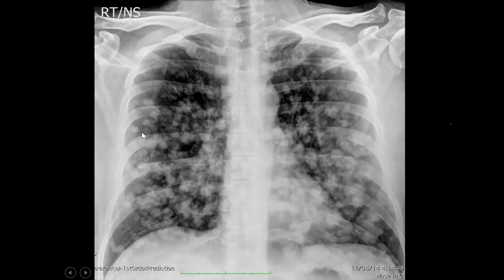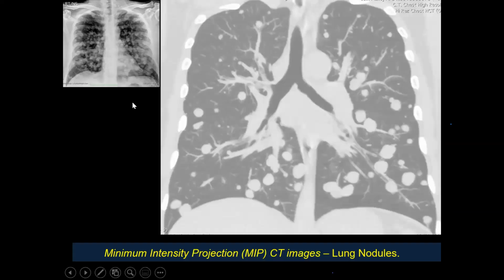If the lesions are of variable size, like one lesion is small, one lesion is large, with variable size lesions always suspect metastasis. If the lesions are of similar size, it can be because of infection, including tuberculosis. If the lesions are not seen on routine CT, MIP images are always better, because they will be able to locate and diagnose even very small nodules as small as 2 to 3 mm. Now, few lesions are large, few are small. So this is typically metastatic nodules, not infection.